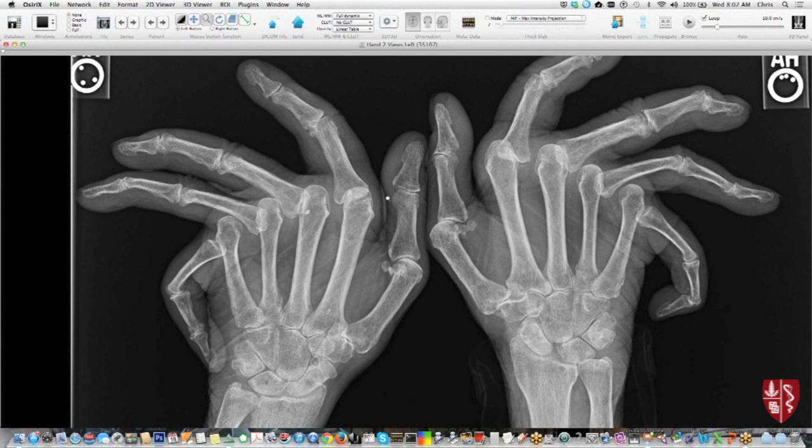And again, rheumatoid being common, that's a common thing. The other thing you could think about in a case like this would be lupus and connective tissue disorders and the kind of malalignments that you can get in lupus. And sometimes these patients have an overlap type syndrome or sort of a mixed connective tissue disorder, and even the immunologists don't always nail down a specific diagnosis for these types of patients. But we can help somewhat by looking at the distribution pattern.